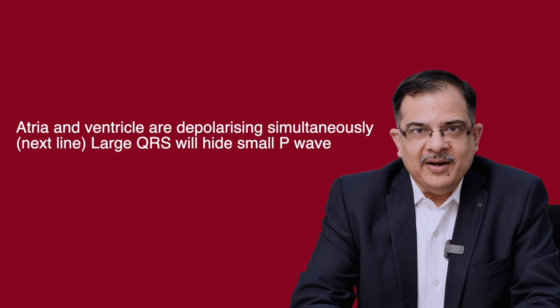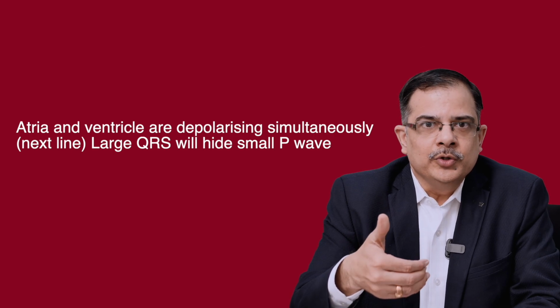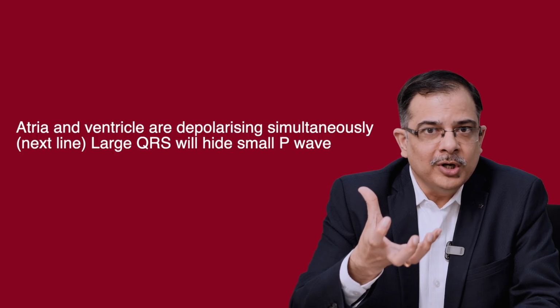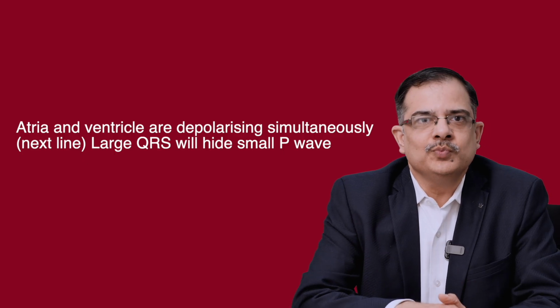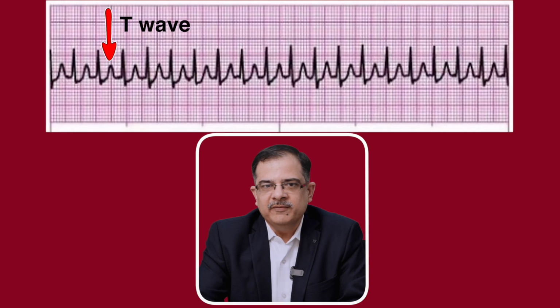When the ventricle and atria are depolarizing at the same time, the QRS is a larger complex that will hide a smaller P wave. When two electrical activities are taking place simultaneously, the large electrical activity will hide the smaller electrical activity. So in this ECG, there is no P wave present, and the heart rate is very fast. Now you will ask, what is this wave then? This wave is a T wave.